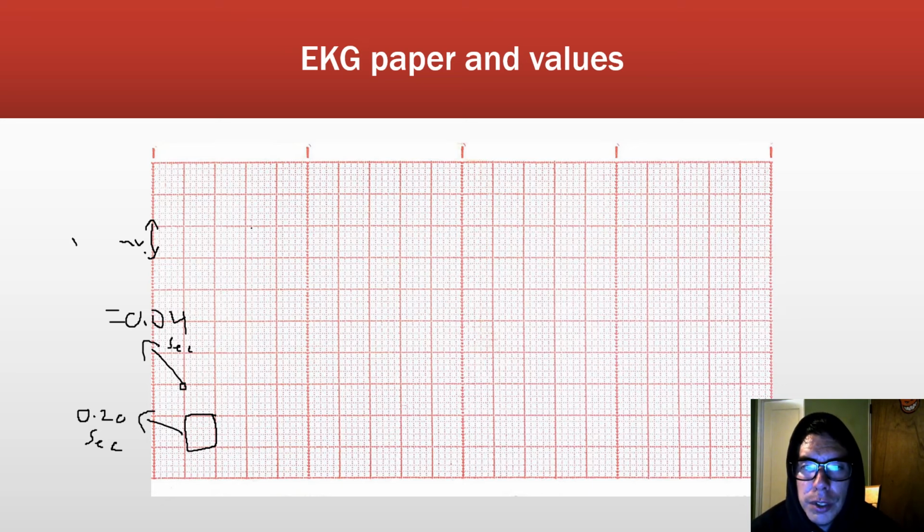So we'll use millimeters, because in 12 leads with heart attacks, we want to see a certain point of the EKG and see if it's elevated above where it should be. So if this were our baseline and it's up here, the space between here and there is 3 small boxes above, so we would say that they have 3 millimeters of elevation.